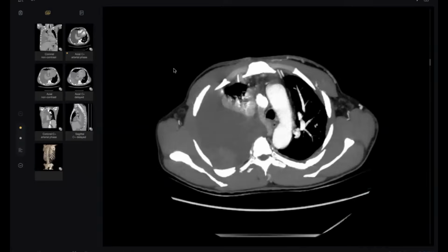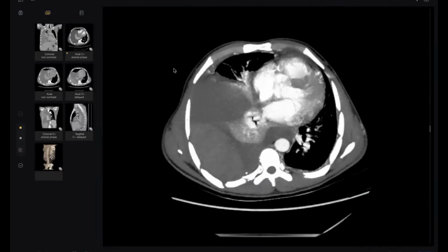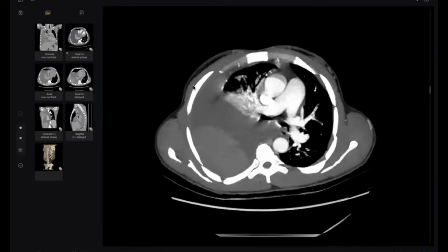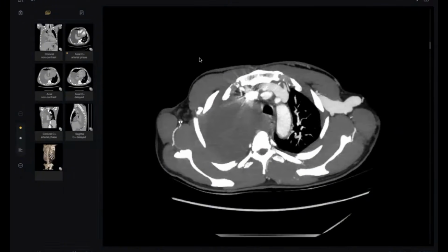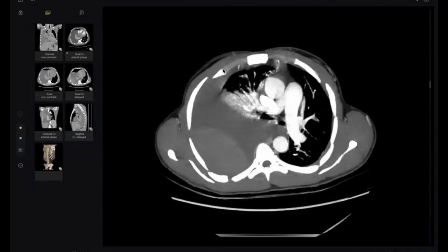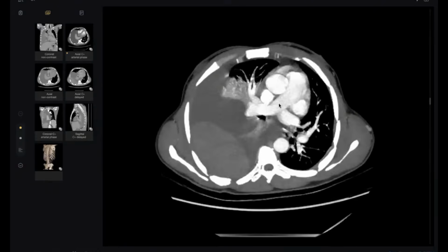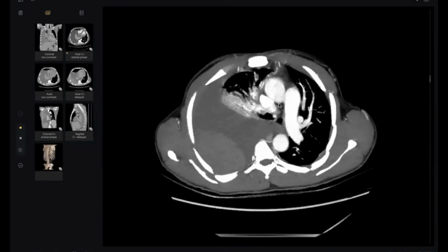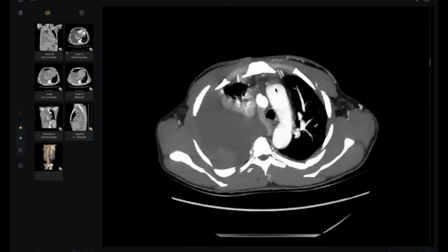A second point: you mentioned in the beginning this is post-contrast chest CT. No, I think this is angio at least. Look, because in the chest we don't do arterial phase. Conventional chest is venous. Look here, the pulmonary is very, very bright. Okay, this is not, by the way, pulmonary angio, because in pulmonary angio we will not see the aorta, but at least this is angio.